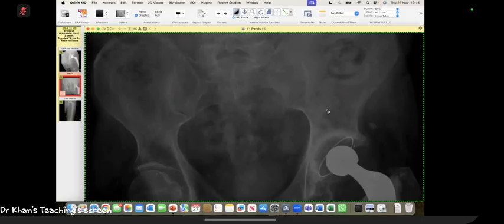My differential diagnosis in this case would be metastasis. Other than that, sir, this would be a chordoma. The third possibility, sir, could be chondrosarcoma. So I will inform my finding to the referring physician and would like to see if any orthogonal view is available, and would advise MRI for further evaluation and characterization of this case.